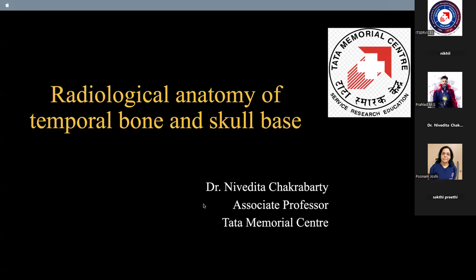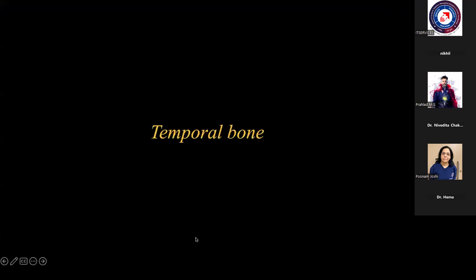I'll be speaking on the imaging anatomy of temporal bone and skull base. I'll basically be showing you a series of images, so none of my slides has any theoretical content. The theory part you can read up from websites and books, but my goal through this presentation is to enlighten you on the key imaging structures.